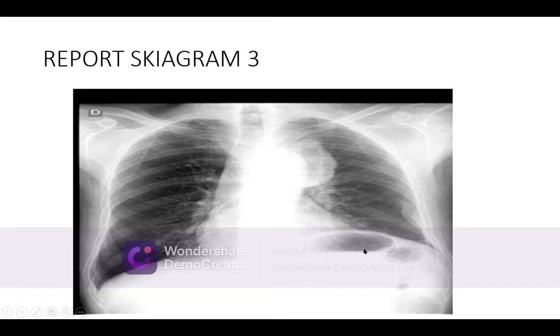In my knowledge, as I have learned previously, if there is a collection of gases in the fundus of the stomach, it will push the diaphragm. Because the heart is very near to it, people think that it is a heart problem because people feel uneasy. This is called gastric bubble syndrome. Possibility of it.